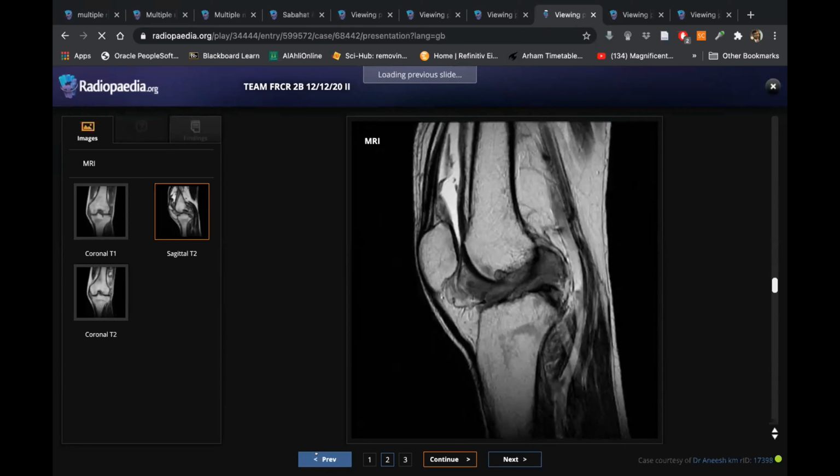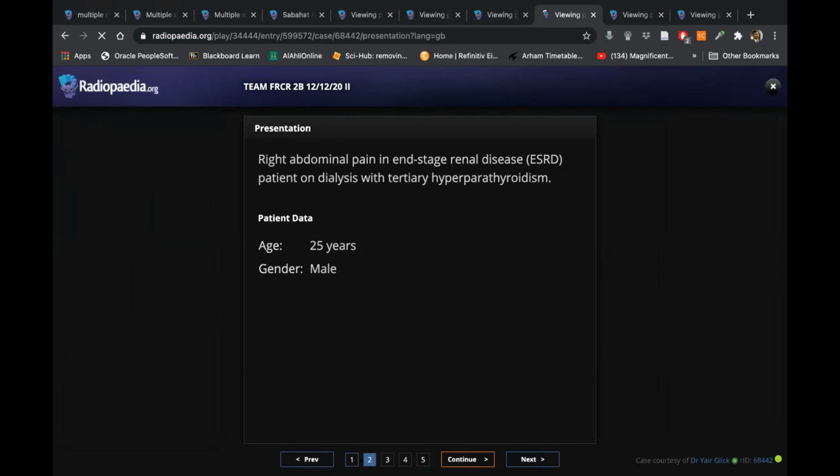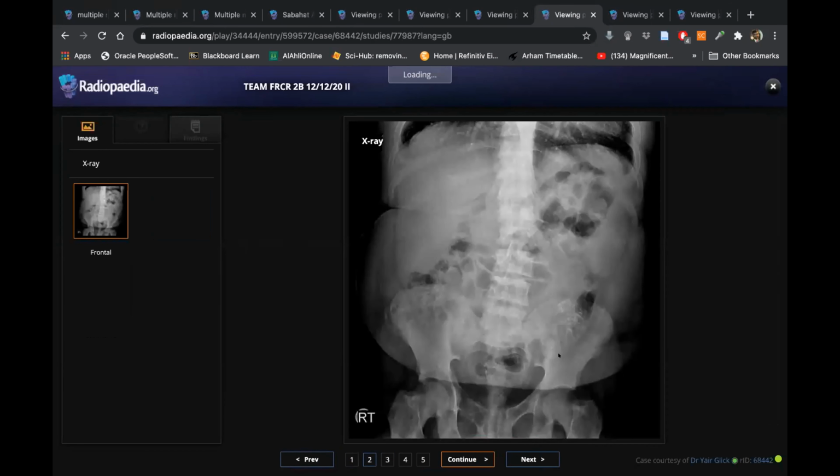So this was good. The other one, this end-stage renal disease, you did well. It's always difficult on X-ray, but let's tune ourselves to this. Whenever we see any stigmata of end-stage renal disease, and we see a calcific focus here, or in the pelvis, or wherever, whenever we see a blotch of calcification, that's a calcified transplant kidney, okay?